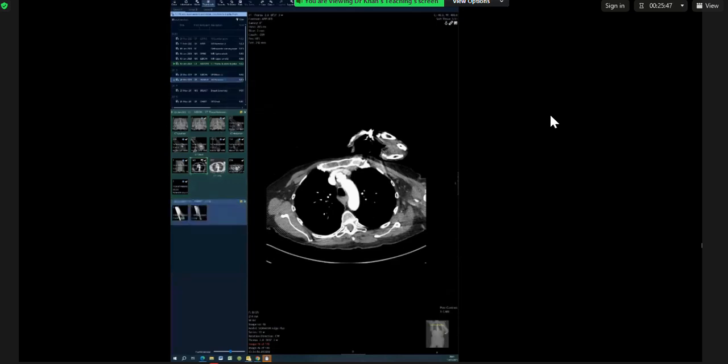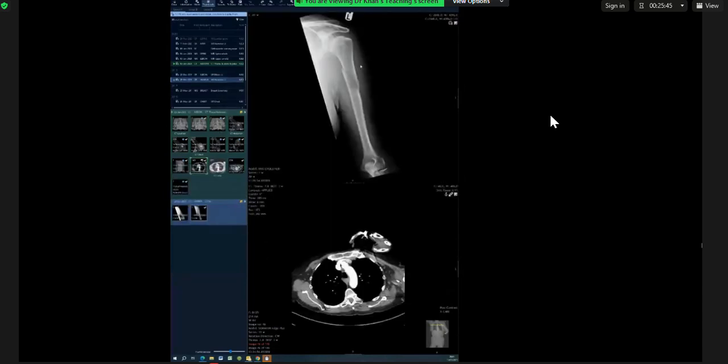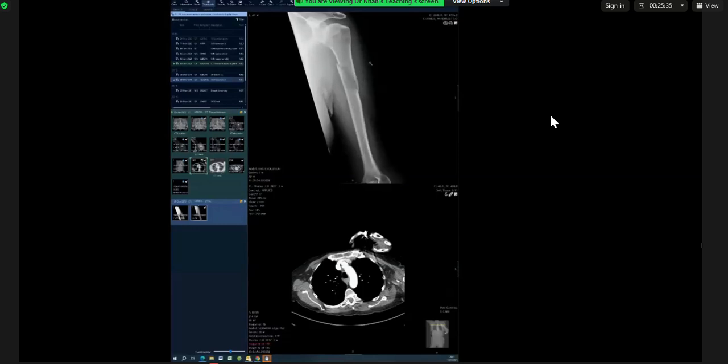So when you see a fracture, nobody's going to show you a plain fracture in a VIVA unless there was something special about the fracture management or the location of the fracture. It's a typical mid bone fracture. It's not going to be a simple fracture. So if you pick the fracture straight away, you immediately need to start thinking about pathological fracture. They're not showing you a fracture. They're showing you something about the fracture they want you to talk about.